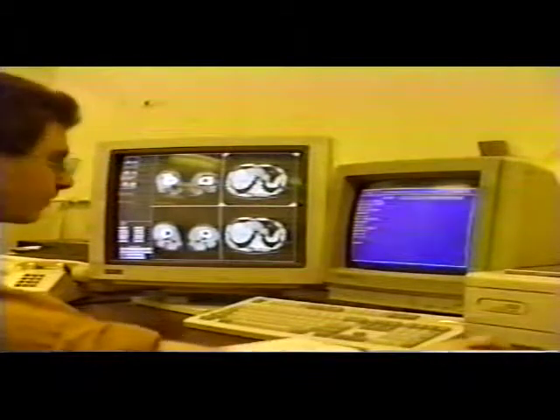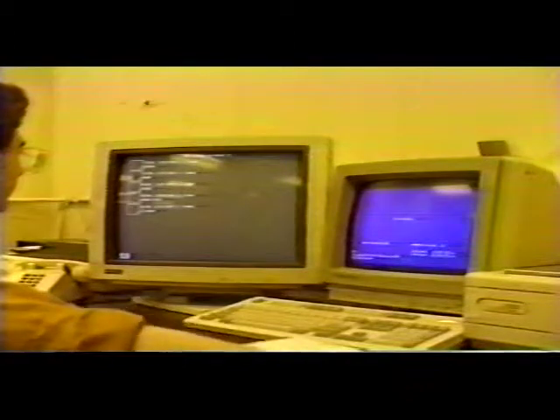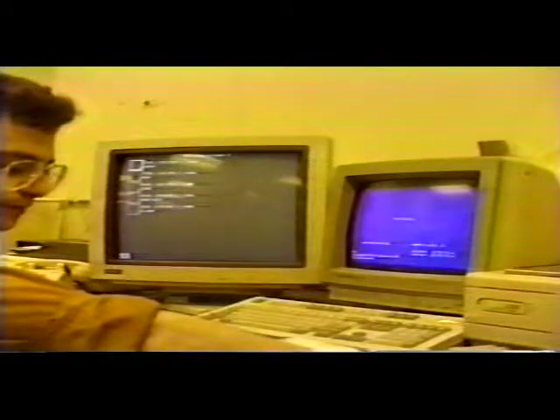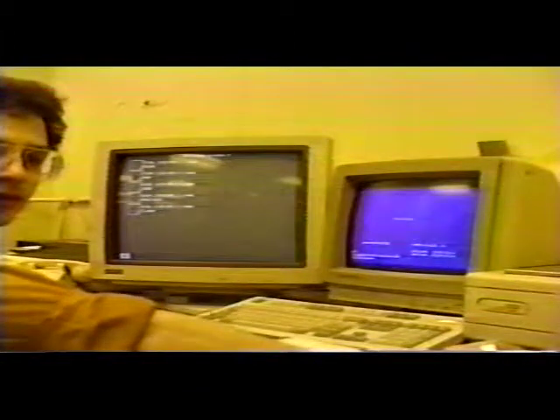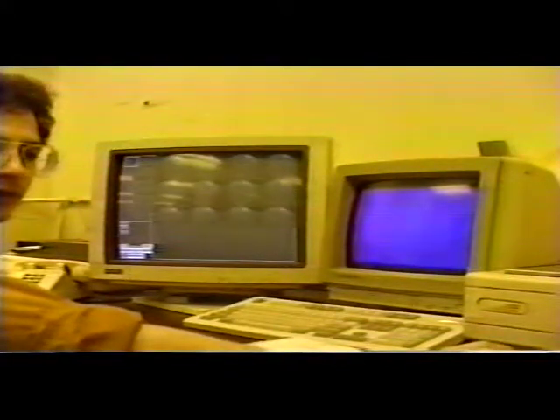Now, of course, there are other modalities. Take that back. These were all transferred to the system on a disk. The files were in the Gamma 11 file format, which is an industry standard. One of the first uses we're anticipating for this system is archiving nuclear medicine.